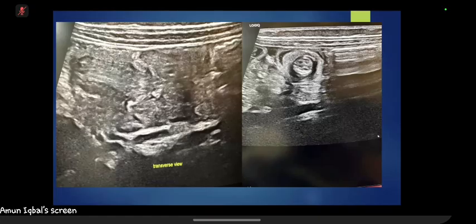First, I will assess the stability and rule out any peritonitis or any bowel perforation symptoms in the patient. Then I will do the fluoroscopy with contrast, air and pneumatic reduction. And if I fail, then I will advise the surgeon.